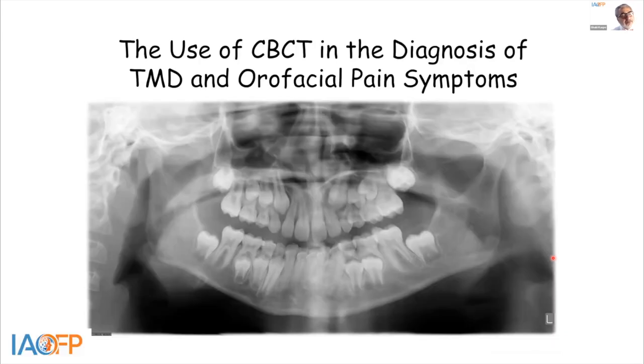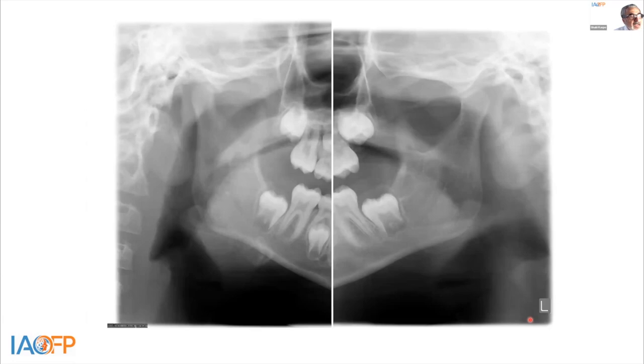Now we have this panoramic X-ray. The pain is on the right side. From first look, everything looks really normal. You don't see any fractures, anything to rely on. Now I did a close up of the X-ray. I always compare right to left. This is the left side, the bone looks nice.